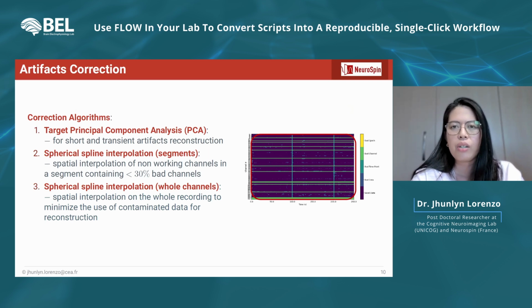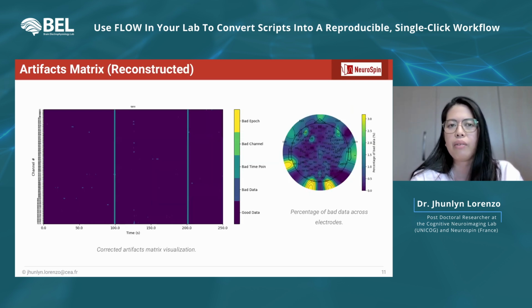After correction, we perform another artifact detection, and here is the artifact matrix of the corrected data. We can see here that there are still some bad time points, which are longer than our criteria and cannot be corrected.